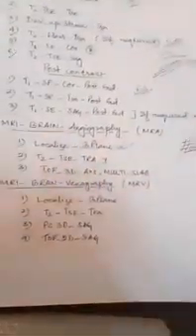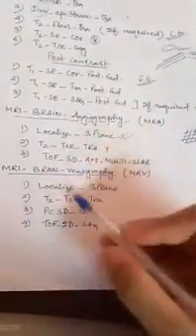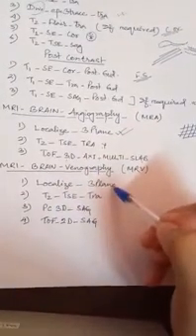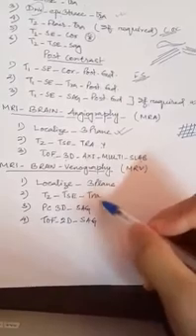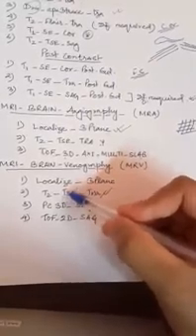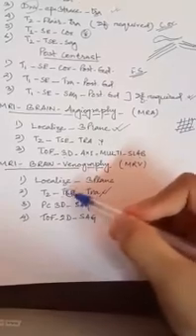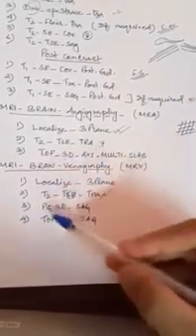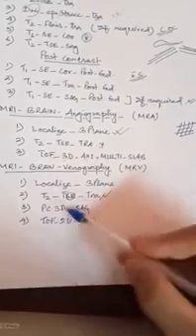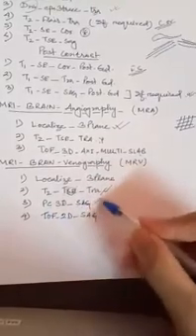Okay, next, if there is any requirement for venography, then we are taking MR venography. For MR venography, again that localizer we have to take. From that localizer we are taking the axial turbo spin echo. Remember, again I am saying that the T is not mandatory, it will not be everywhere in your system. So remember the spin echo T2 sequences. After that we will take PC 3D SAG. PC means phase contrast 3D sequence. It will be in sagittal mode.